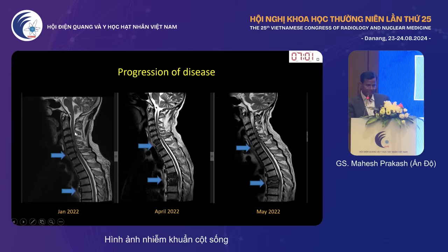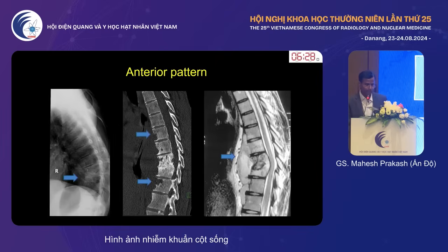Here, the initial MRI of the patient in January looks normal, but after 3 months you can see the changes at the typical places of spondylodiscitis. So the dictum is that if patients have very typical features, and MRI, which we all know is very sensitive, doesn't show changes, you must not stop there. You can follow these cases and find the changes on MRI later.